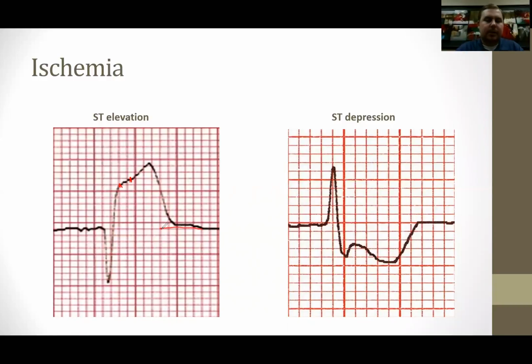So I'll do this on my 12 leads whenever I'm trying to determine exactly how much elevation there is. So I'll draw that line all the way out from the TP segment down underneath where I marked to measure. And then I'll just count. 1, 2, 3, 4, 5, 6, 7, 8. So this is 8 millimeters of ST elevation.